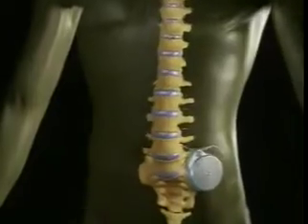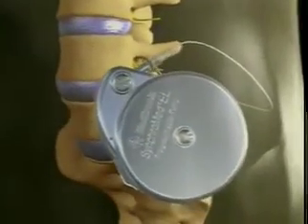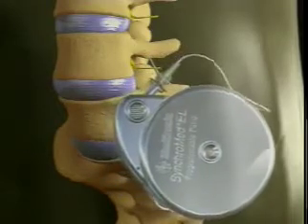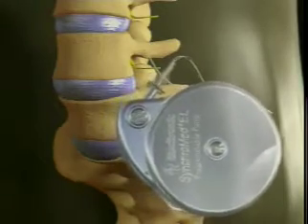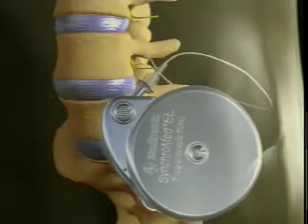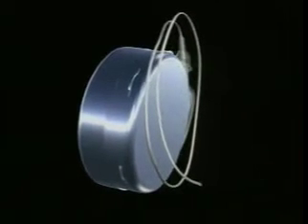Kinks can occur within the pump pocket if there is insufficient catheter slack or if the pump is oriented improperly. Either of these situations can subject the catheter to increased tension from body movement, particularly at the pump connection site. Excessive pump movement within the pocket can also kink the catheter, especially if the pump flips over or spins on its axis. To minimize kinks at the pump pocket site, coil at least one loop of catheter behind the pump.